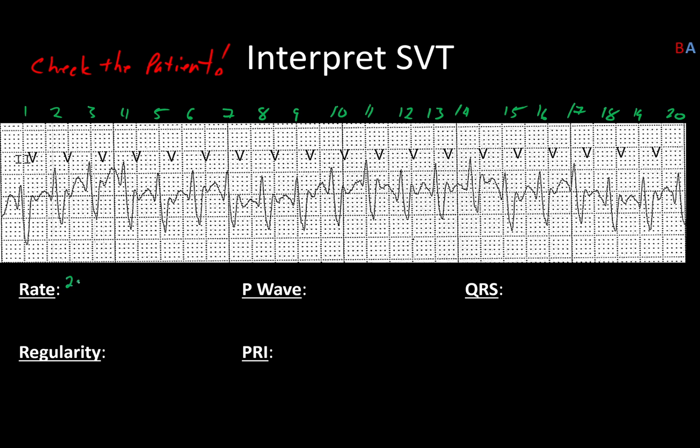All right. So rated 200, very tacky. And no ectopy.